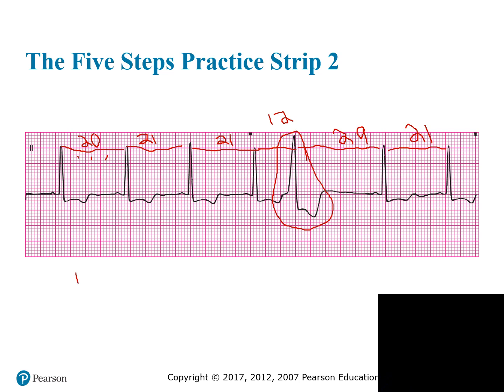We would say this is regular with, or interrupted by, but we're going to do shorthand, regular with a premature beat.